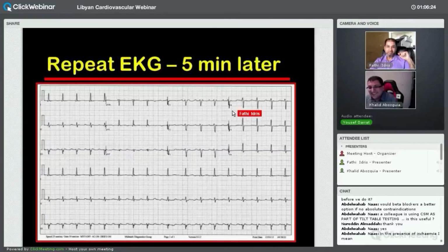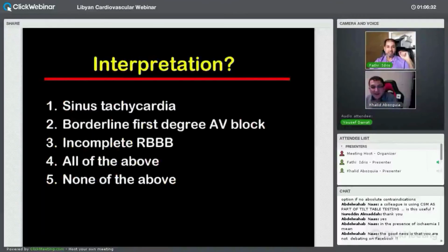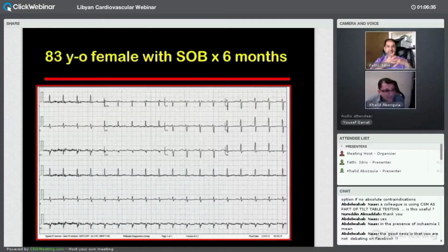Can I just ask you to show me the ECG before this one? Okay. Before this one, yeah. Let me just go back. This one here. Yes. Yeah, you can't tell, right? I think, you see, there is a suspicious wave here. I don't know if you map it. Will this be your P wave here? See that? Can you show that again, Khalid? So let me just show you. Yeah, sorry. I'll show you.